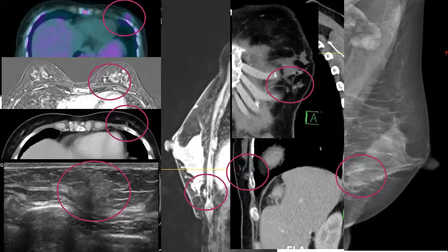Yes, because she's a female, even if she's young, I was arguing in that way. Since she's a female, we have to think about breast cancer. We have to exclude breast cancer. And we have to consider any lesions to make sure it's not cancer in this lady, since she has metastatic disease, unless we could find another primary. Since there is no other primary, you see, breast will be number one.